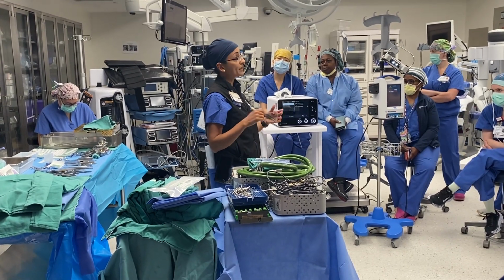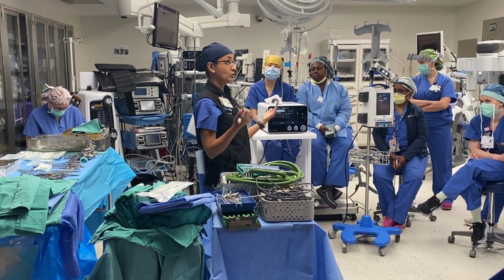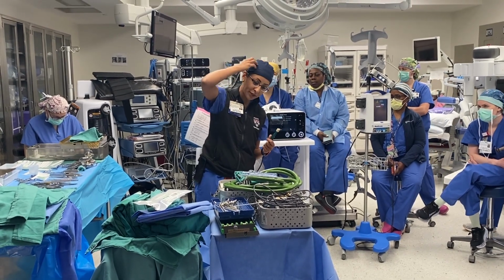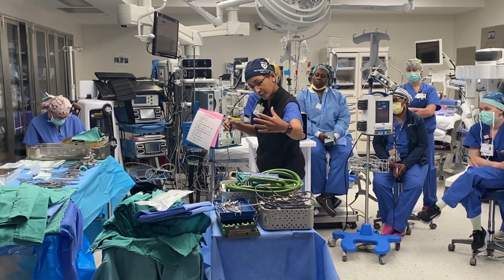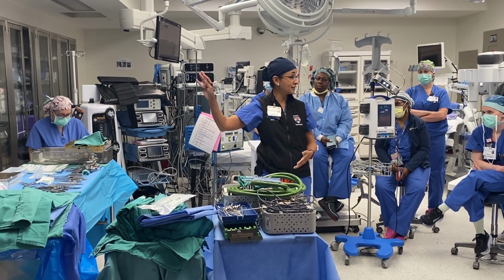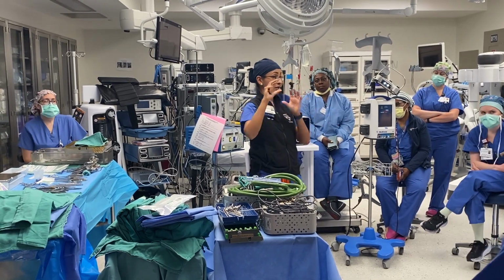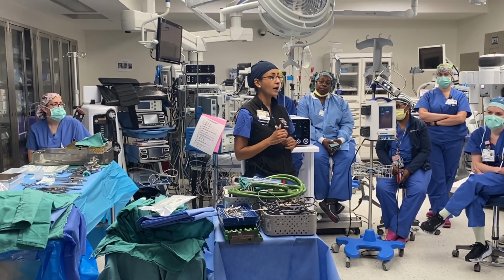And the scope, something important to ask us before it's getting balanced and everything is, are we using an observer, and which side? So you can imagine if we are inside the head for a tumor, we're going to be looking down inside the head. We're going to want our observer on the side of us. They can't be across from us because the patient's body is over there, right? So that's a little bit different than other uses of the microscope. So often we have to move the little eyepiece and put it onto the side and then balance it, okay?